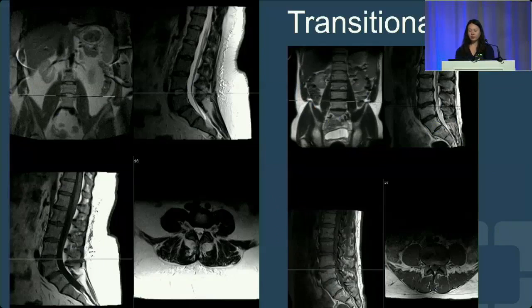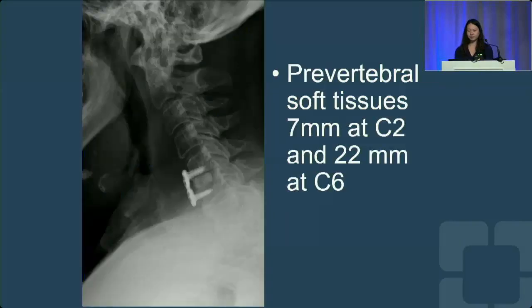What we try to do is we try to have our marker for L4-L5 be at the level of the iliac crests. And that way we can kind of be consistent. But just one thing to note that we do try to say if there's transitional or non-conventional anatomy to make it easier to localize the lesion and reduce the risk of wrong site surgeries.